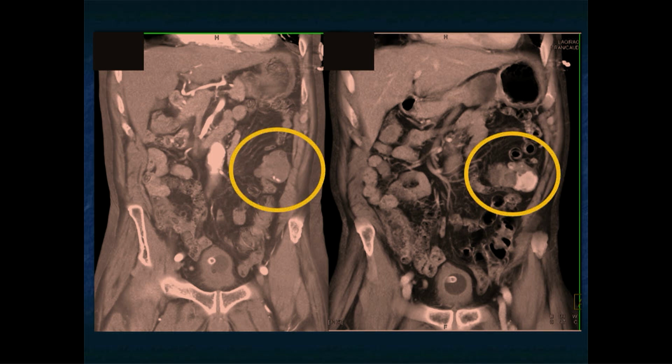If you're doing interventional procedures on this patient, the likelihood of the angiography being positive is more than 50% higher. Also, by being able to define the site of bleeding, one of the advantages of CT over nuclear studies is we know precisely what vessel is typically bleeding, and so angiographers, even in the face of a negative angio, will still be able to embolize.